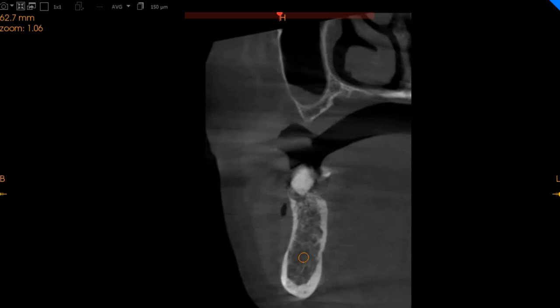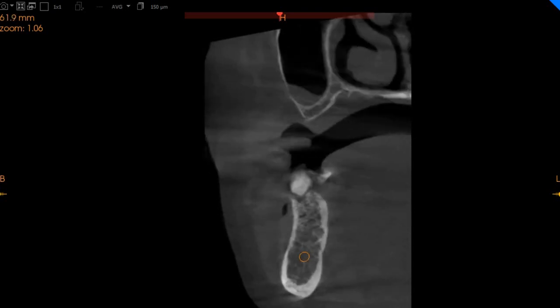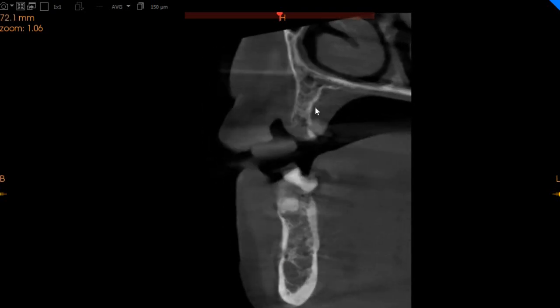Distal to this, we've got very thin ridge and very resorbed ridge, and unless a sinus lift is done, the posteriors cannot be included, even the premolar region, because this is just the second premolar region, and here we've got approximately, apologies, 6 millimeters of width with 10 millimeters of height. But again, the bone dips here in the middle and becomes 4.7 millimeters in the middle of the ridge.